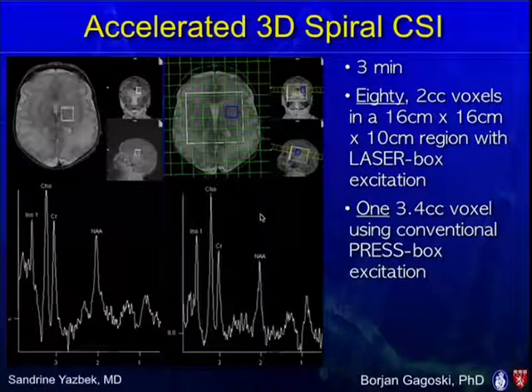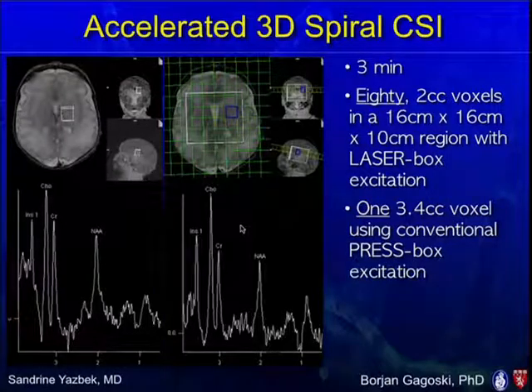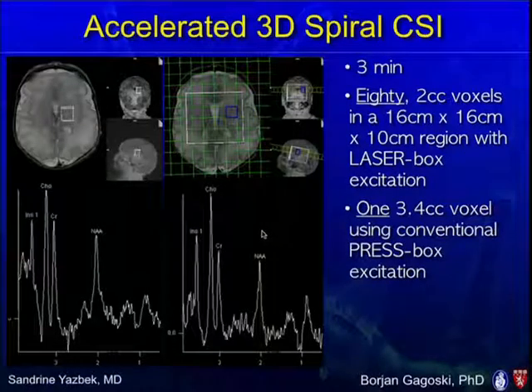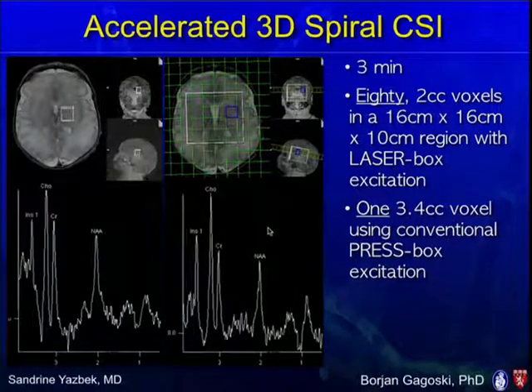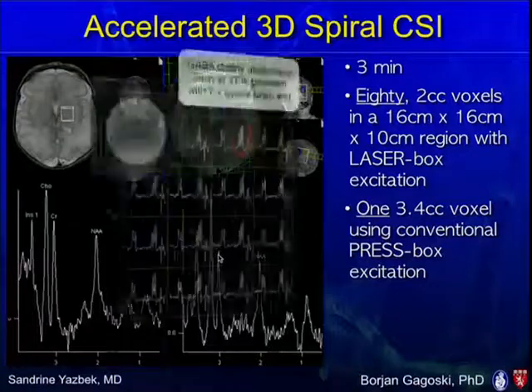Because I know that at least I am still way undercalling probably what is abnormal, because I don't have good enough normal data to know what the means and standard deviations are in different regions of the brain. But I think it's something that will help triaging, and as I was looking through the cases to make the talk, I was surprised at how many of the ones that had normal ADC maps did have lactate. So I think that this will be helpful in terms of understanding who's at risk, even if they are cooled.